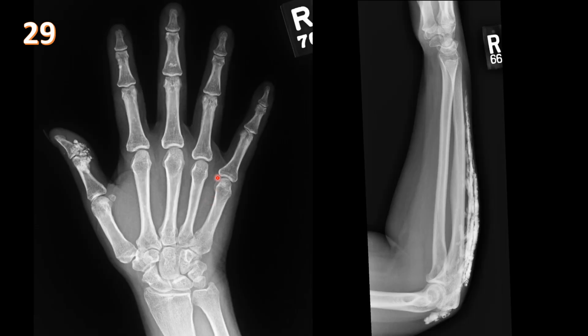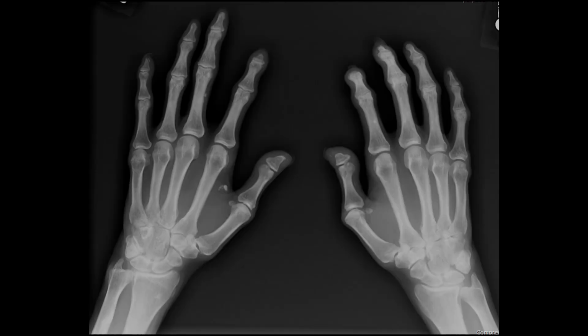Case 29, we have a PA view of the hand and the forearm, and we see that there are clumps of soft tissue calcifications, not ossification, cloud-like, chalk-like around the interphalangeal joint of the thumb. We see some here superimposed on the bone within the soft tissues. And we also see here in the forearm, they're sheet-like calcifications. This is another patient with the same condition.